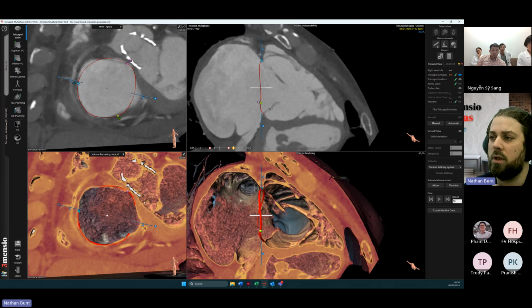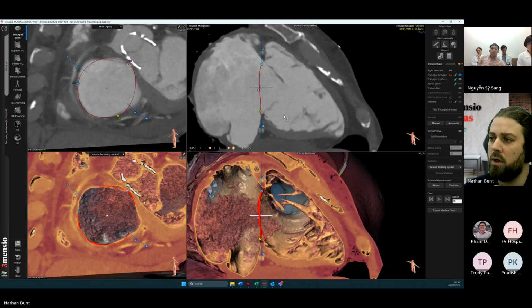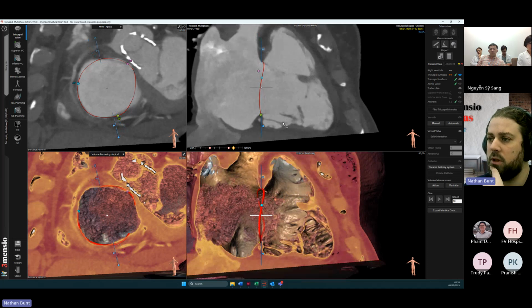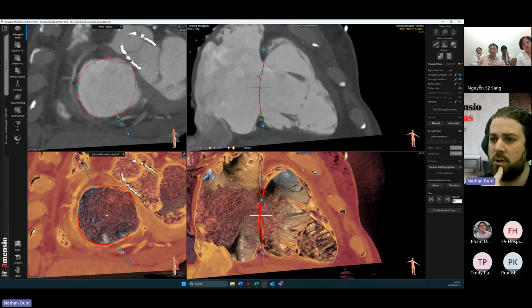One way of doing this is by looking at your long axis view. We can clearly see a leaflet here at the bottom. When we slowly rotate, we'll see the leaflet become smaller and smaller, or the cross section of the leaflet. And then at some point, which is approximately here, the leaflet will have fully disappeared, and there we see it return again. So in this case, the SP can go slightly counterclockwise, but apart from that, it looks all right. So that's one way of trying to find or double check the commissure points.